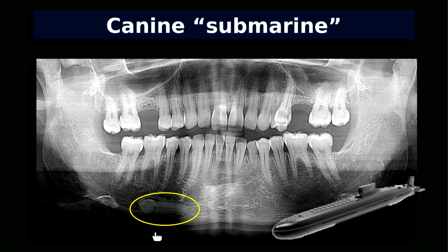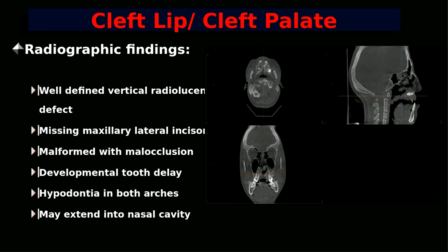So that's very useful. And if you have a cleft lip, cleft palate, this patient, I just saw today. You can see there's a cleft lip, cleft palate here. Unilateral cleft palate goes all the way from, this is the anterior, that's posterior, goes all the way. And in this case, the patient has also undergone surgery of the soft palate, which is attached. So when the patient breathes through the mouth, that is very interesting here.